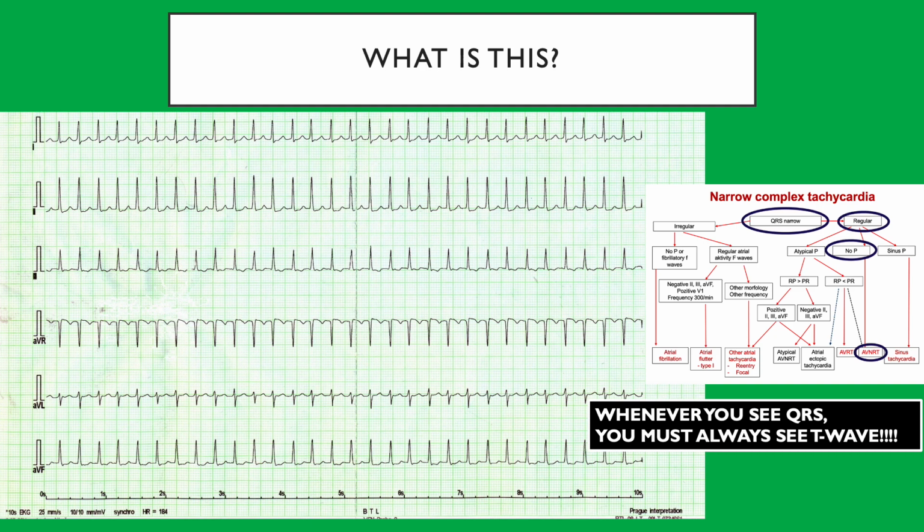And that's your T. A lot of students say sinus because they think it's a P. But if that was a P, then where is your T wave? Remember, everyone makes this mistake, all the students make it. Even I did it when I was in school. So now you remember, when you see a QRS, go after, that's a T, and then you try to find the P. It's tricky, that's actually from my lecture in uni. That's what the professor used. So that's another important thing.